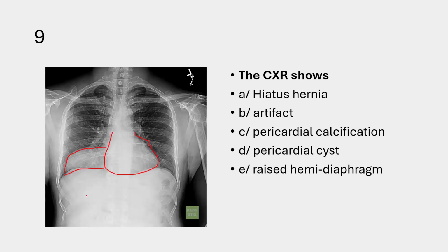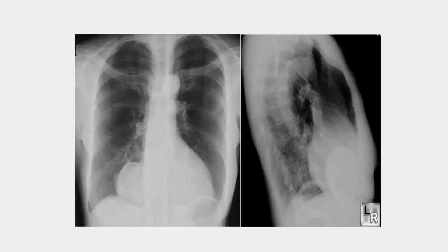And the pericardial cyst is simply an encysted chronic pericardial effusion. Okay? And this is the typical location. So you are going to find it around the right atrium. Yes? Most common location. And it is so impressive on chest X-ray. You see it this way. So this is pericardial cyst. If it's a hiatus hernia, you're going to see it more on this side, and it is going to be air containing, not as dense as this one. So this is pericardial cyst.